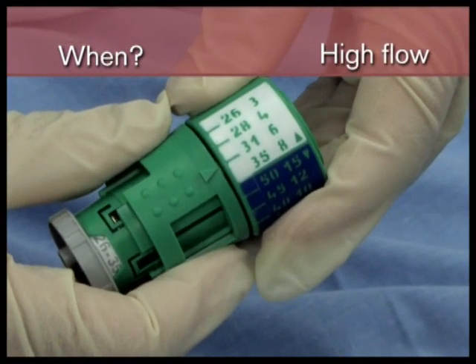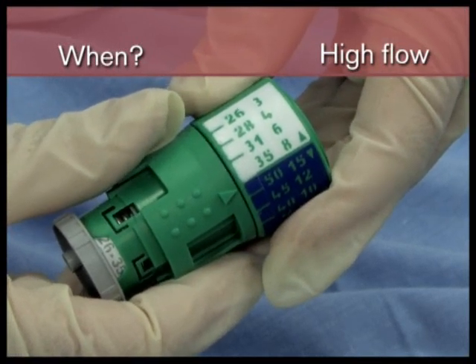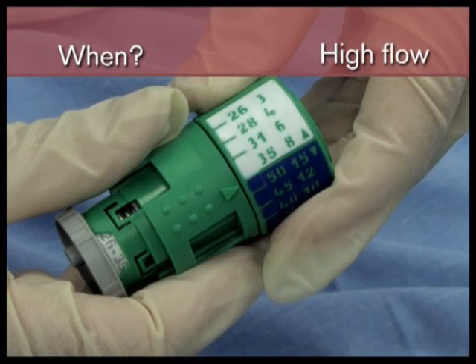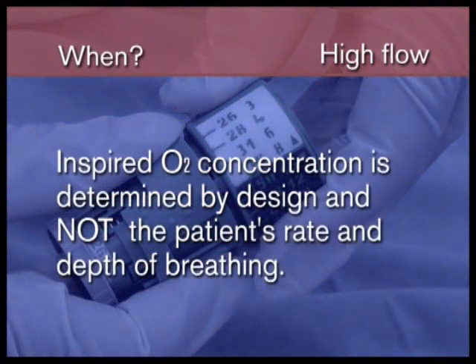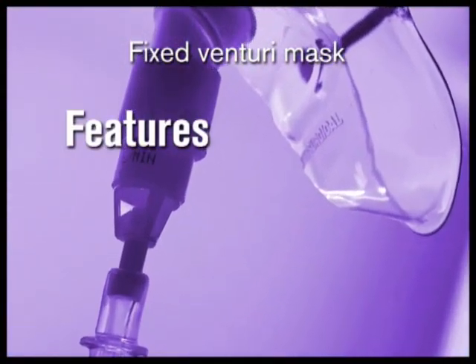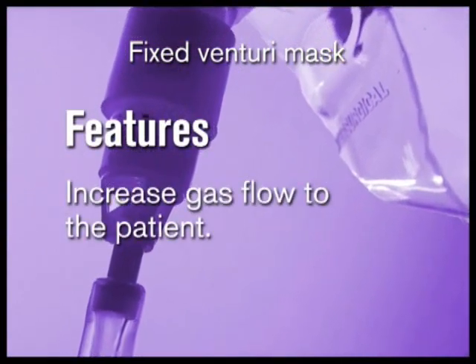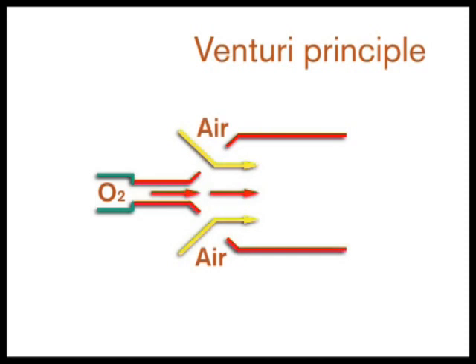In this instance, a high-flow device in which the oxygen concentration can be carefully controlled and guided by blood gas measurements is more appropriate. The inspired oxygen concentration is determined by the design of the device and not by the patient's rate and depth of breathing. Clinically, Venturi devices are used to increase gas flow to the patient because air can be entrained using the Venturi principle. These devices can be used to deliver accurate oxygen concentrations by mixing air with oxygen.